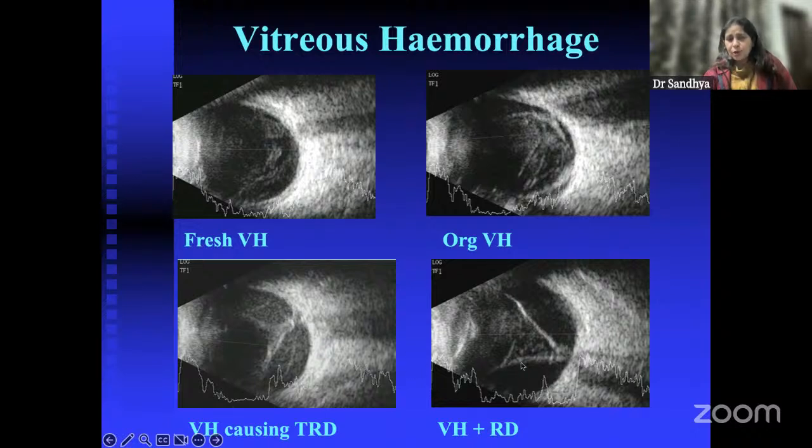And in the bottom right, there is a vitreous hemorrhage with a detachment. Now you see this membrane of retina. Now the retina is also detached. It is getting focused or stuck, or converges to the optic nerve head. This is a little thicker membrane, and notice this is a small, thin, tiny membrane. So this is a PVD associated with a retinal detachment here.